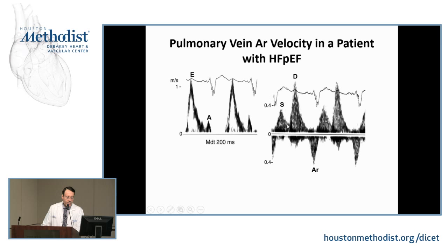Look at the pulmonary vein signals. Diastolic much higher than systolic, rapid descent in that diastolic velocity. And look how the atrial reversal is a pretty large velocity, both in duration as well as in amplitude. Of all the Doppler signals that we talk about, and we say Doppler velocities are affected by age, well, that atrial reversal velocity has been shown not to be affected by age.